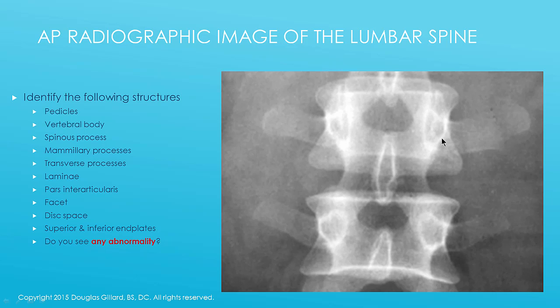Okay, so always look when you're reading an X-ray. You always look to make sure to see the eyes and the nose. There's an eye. There's another eye. Okay, and then make sure that the lamina is filled in between the nose. Here's the nose, the spinous process.